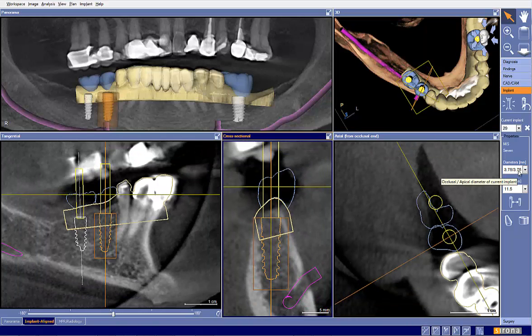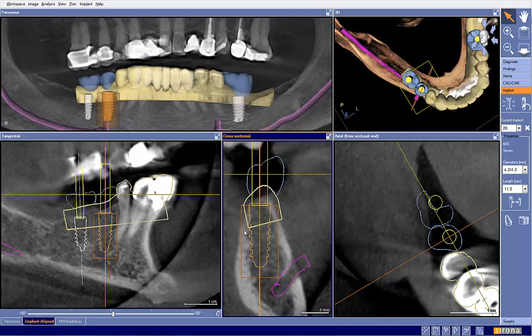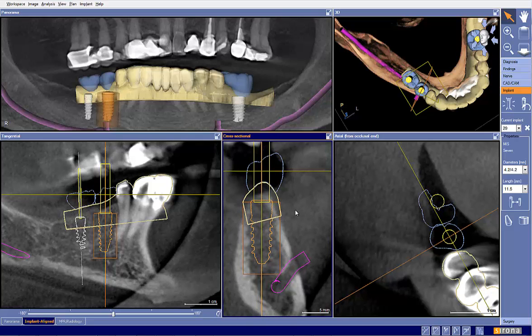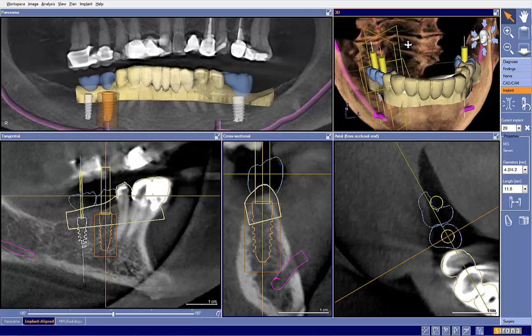Again, I'm okay with the 3.7 here. Ideally, I'd like a 4.2, but we can see on the buccal lingual, I don't like to be engaged into the cortical plate up and down the entire implant. I think this is more of our ideal position, and again, this may require just a hair of grafting at the time of placement, but nothing that can't be done pretty predictably.